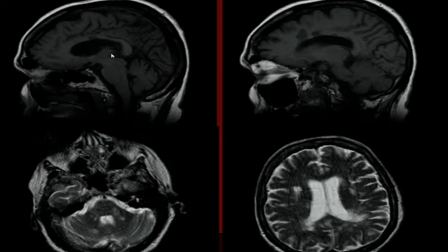Tumors that involve it include GBMs and primary CNS lymphoma. They can cause the butterfly. They can cross from one lobe across the corpus callosum to the next. And in this condition, which here, it's a young person. So what do you think this is? Anybody? Multiple sclerosis. This is a patient with multiple sclerosis.